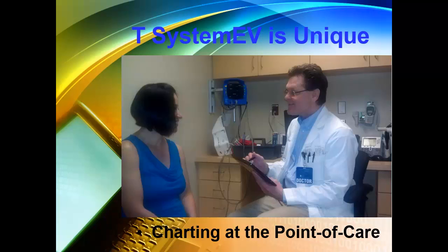It was only after the computerization that we had to leave our patients in the room and go and sit in front of a computer for a long time and then go back to give the instructions and prescriptions to the patient who had been wondering where we were and what we had been doing. T SystemEV allows us to get back to where we were before computers separated us from our patients.